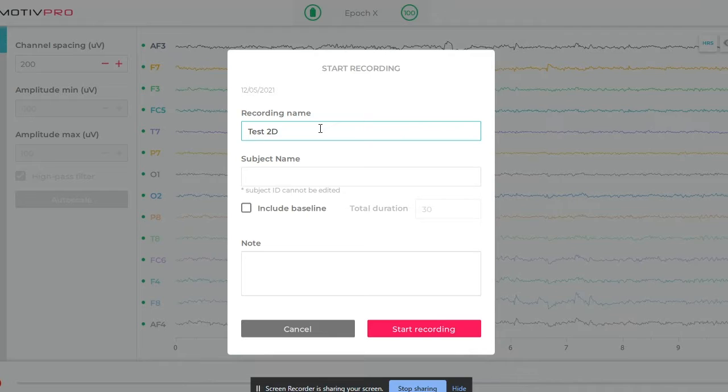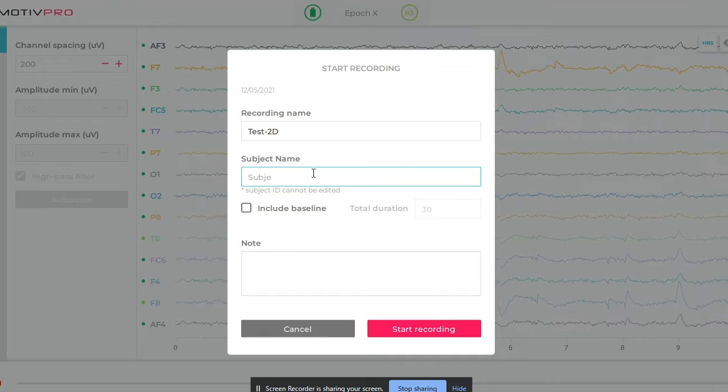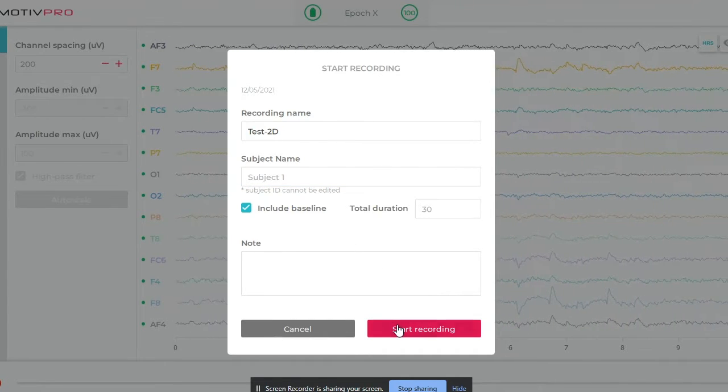In addition to the subject name and the title of the trial, a baseline would be selected, which gave a distinction between eyes open and eyes closed. This could be used for comparative data of other events in the future.